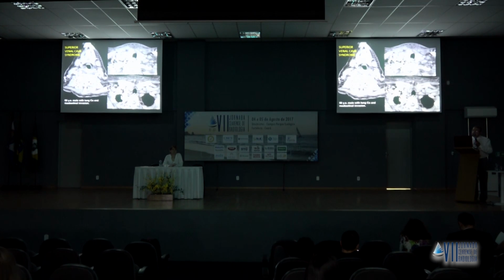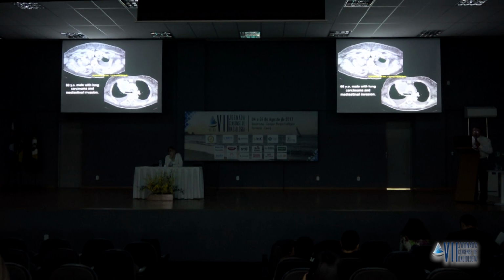This patient had a superior vena cava syndrome, and you can see all the collateral vessels bypassing the occluded jugular vein and superior vena cava. And you look here, a large mediastinal metastatic tumor from the lung, causing this superior vena cava occlusion and stasis of the lymphatics and vessels. Look at the walls, how striated and edematous they are.